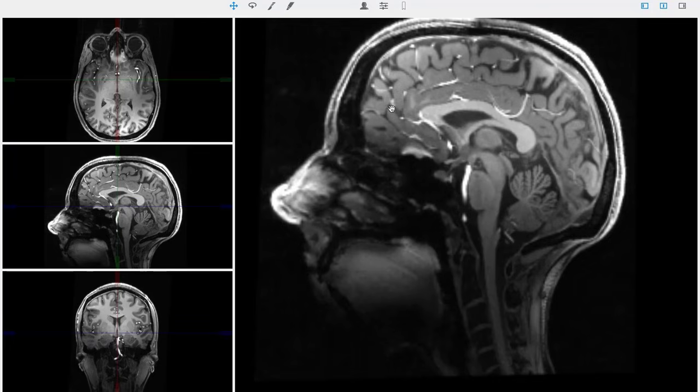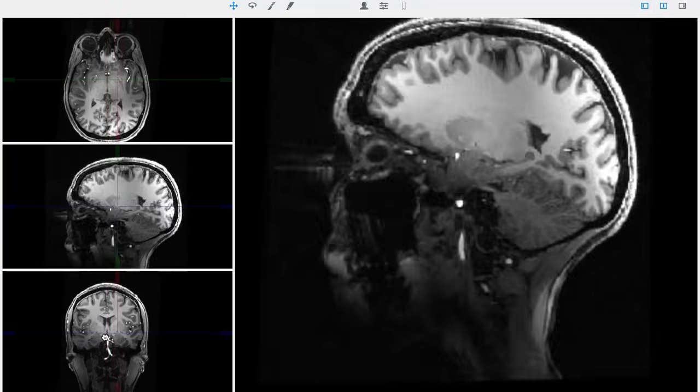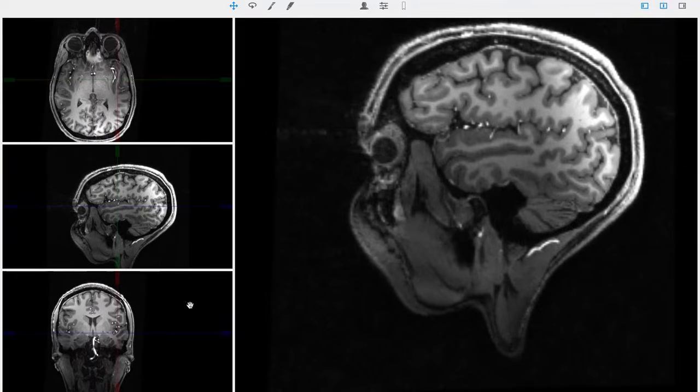And we can also see the lobes quite well. So frontal lobe, parietal lobe, occipital lobe, and then laterally, we don't see temporal lobe here because this is a mid-sagittal section. The temporal lobe is going to be lateral. So out here you can see the temporal lobe.